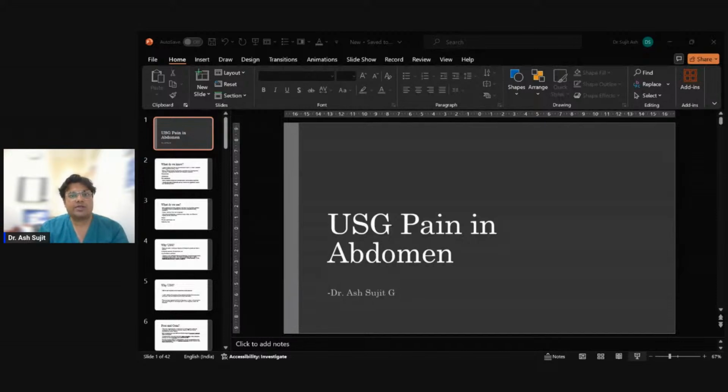Another hypothesis is that venous thrombosis and infarction produce symptoms before the arterial supply is compromised. Therefore, with torsion, you might not see any whirlpool sign or you might not notice anything. Again, this is one of the reasons why you should not do an oophorectomy. Torsion may also be incomplete or even intermittent with transient restoration of blood flow in episodes of torsion. In appropriate clinical settings, when you have an enlarged unilateral ovary, you should always think about ovarian torsion and do a color Doppler just to rule out the torsion.